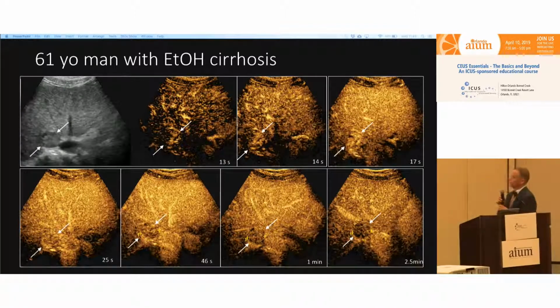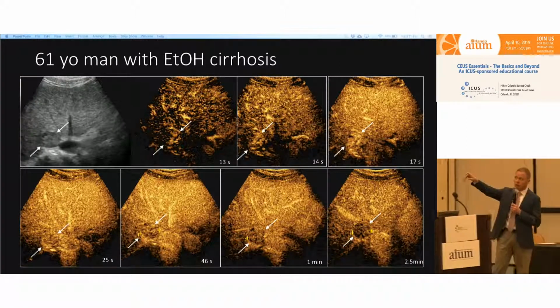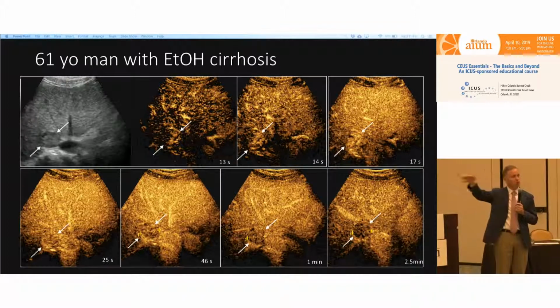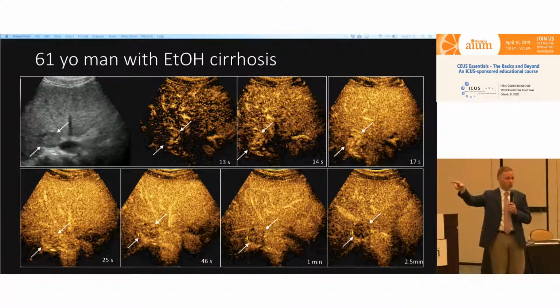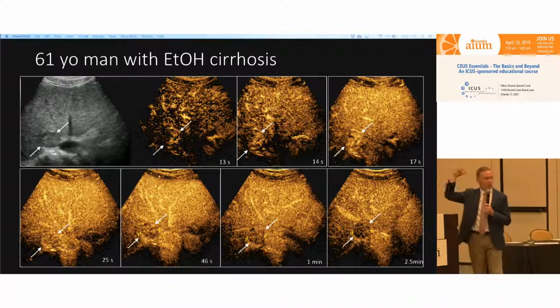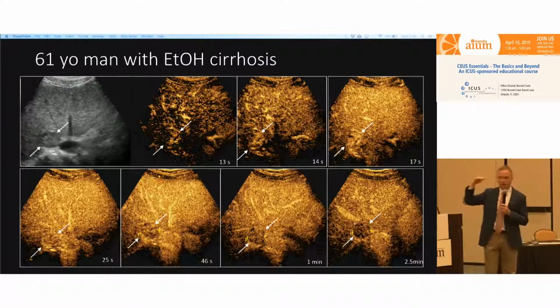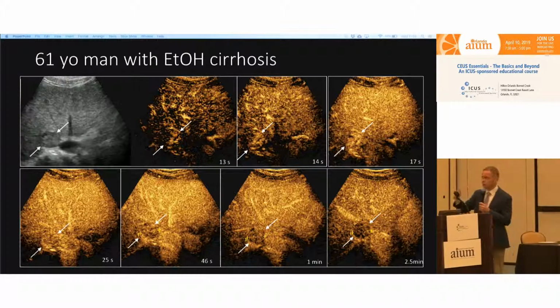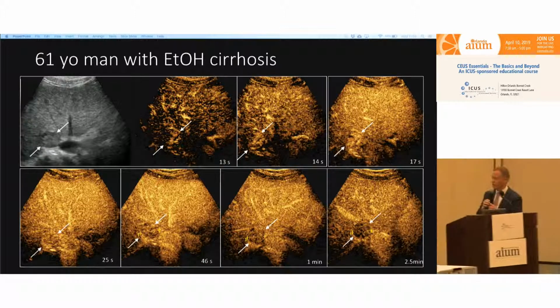So this was just screenshots, and honestly, I quite often look at my cines like this. I go back to the scanner and I roll cine frame by frame by frame by frame. And I always use dual calipers that are available in most of the scanners, and I measure my lesion on grayscale, and I look at what it looks like on contrast-enhanced ultrasound. Okay? So doing this, in my mind, is very, very helpful because my brain doesn't work as fast as some others. I cannot see everything I need to see on those cines, so I always do this frame-by-frame analysis.